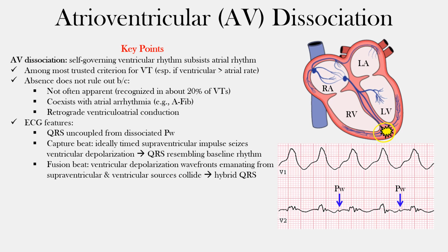When interpreting a 12-lead EKG displaying VT, AV dissociation may be recognized as interspersed P waves that are nestled between or hidden amidst overlapping QRS complexes and T waves. If you look at this figure here, I've highlighted them. So these are the P waves that we're actually seeing in this lead V2. Notice here are two P waves nestled in between our QRS complexes, which are these ones here. Notice they're quite difficult to see, even hard to see in lead V1, but they are there in this case. And so, as you can imagine, sometimes even the best EKG interpreters have difficulty trying to identify these.